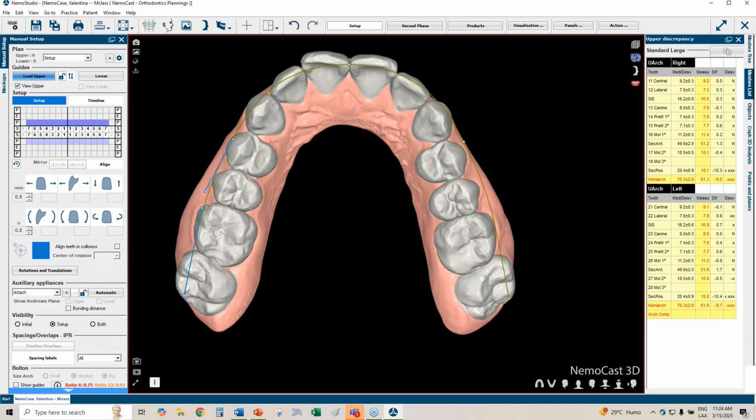Let's say we're just going to place it. Whenever you click a specific point, you can get the arch to form a little bit better, and we can now use this arch perimeter to visualize our differences in spaces.